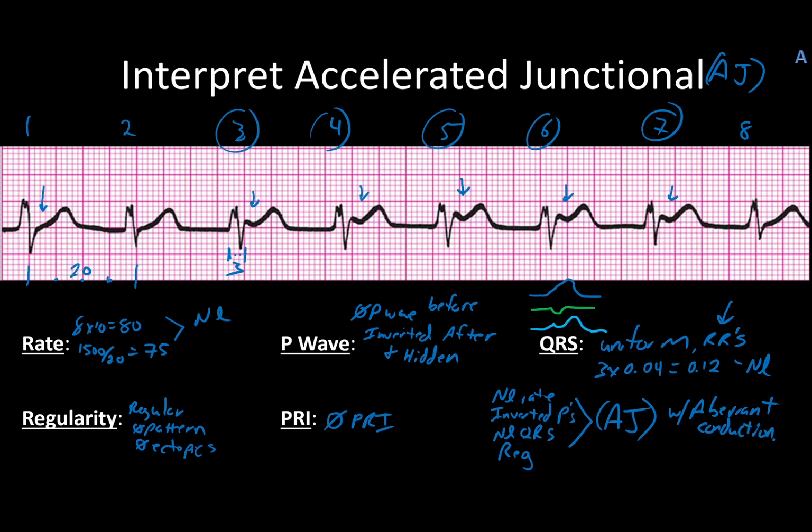Of course, try and get a previous EKG on this patient or anything so that you might be able to compare it and see, did they have a bundle branch block or something beforehand? The fact that we came in at a normal 0.12 tells me that it's more likely to be aberrant than it is to be a bundle branch situation.